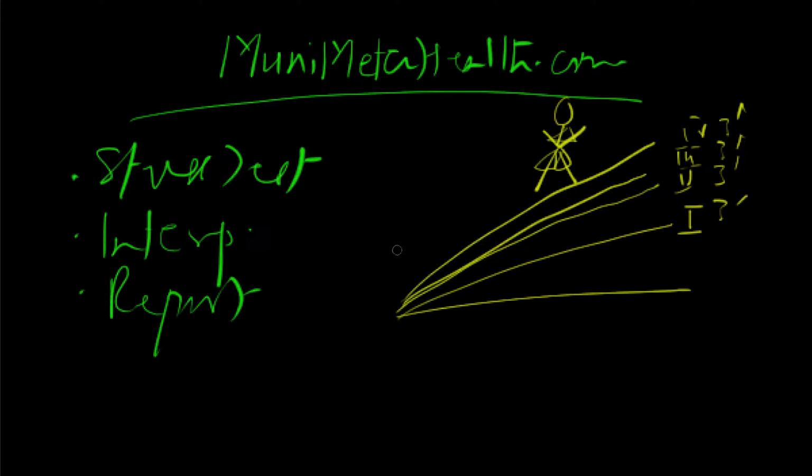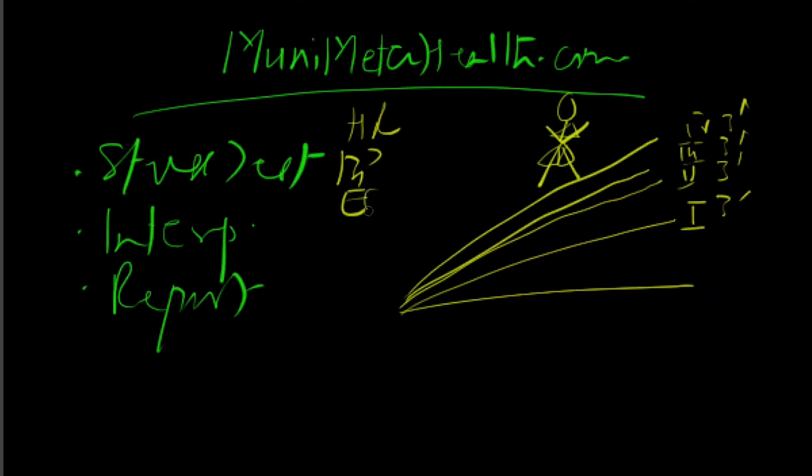Now, how do you define the maximum heart rate? Well, first of all, you'll be looking at the following parameters: the heart rate, the blood pressure, and obviously the ECG here. These are some of the parameters that people tend to follow. Now, obviously, you follow the heart rate and say, look, the heart rate response was normal, or it was exaggerated, like the heart rate really went high, which is abnormal, or the heart rate response was blunted. If you have a blunted response, you define that as well. That means the heart rate failed to rise during the change of stages as we went on from incline to the speed.